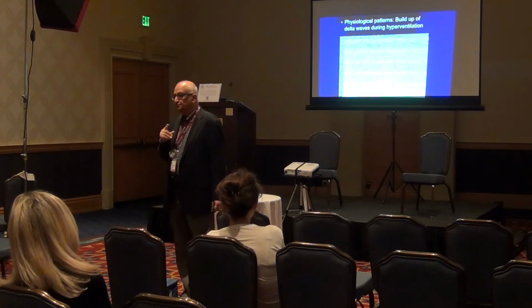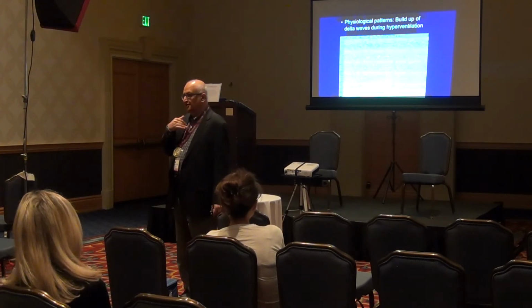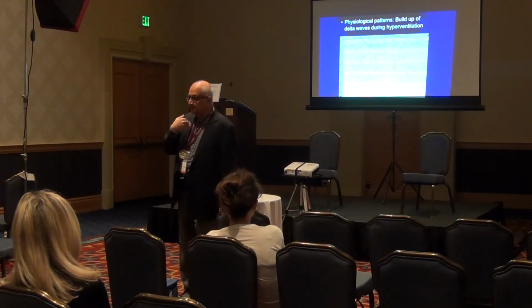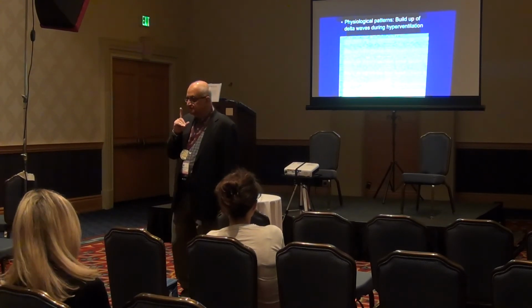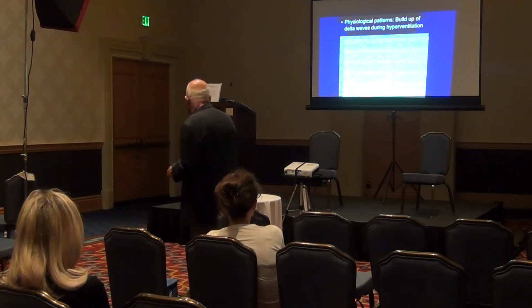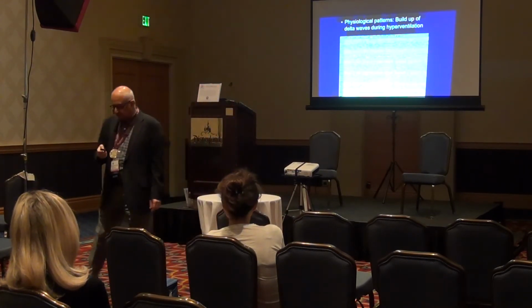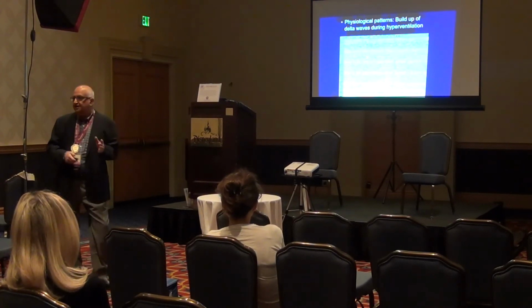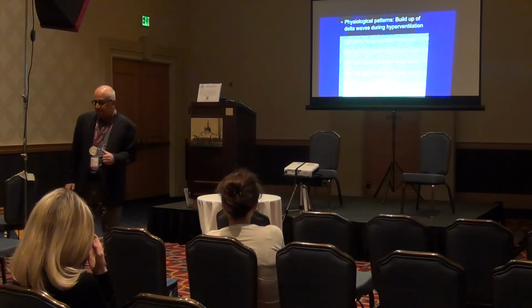You're doing this to blow off carbon dioxide. When you blow off a lot of carbon dioxide, it produces biochemical changes in your brain. And some people, normal people, would respond with slowing when that happens. So what you see here is instead of that alpha rhythm, notice, you've got sort of a theta delta. That's an okay change.